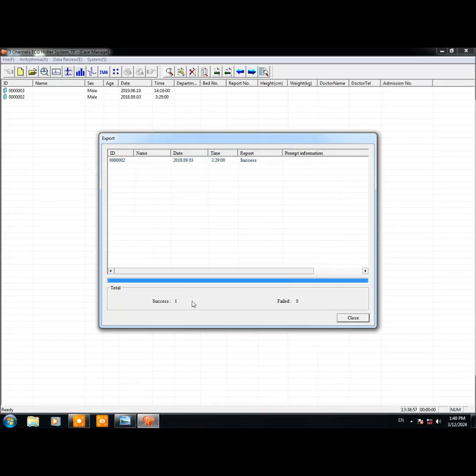There, it says success. So this has been successfully exported.